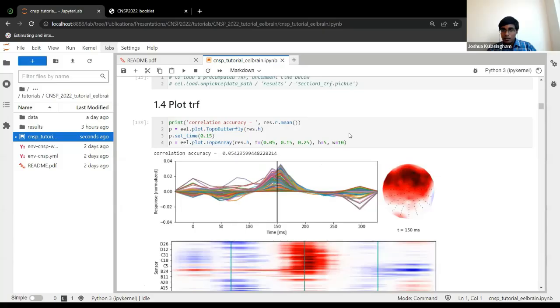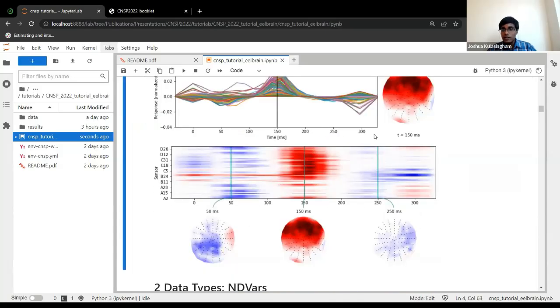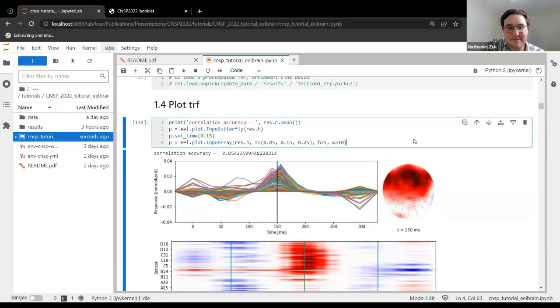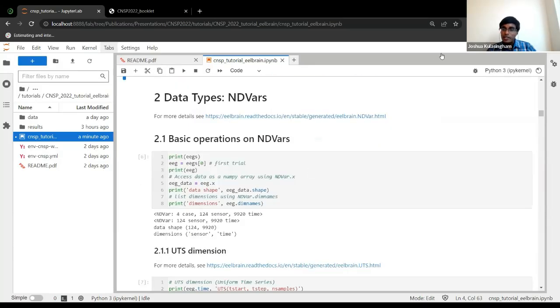Okay, has everyone got this working? In this case, you're fitting it independently to each channel? Yeah, that's right. Boosting will fit the TRF independently at each channel. So has everyone got this working? And once again, if you don't get all the details of the functions, I can tell you later on. Okay, I think it's all fine. Right. So again, at any point, just stop me if I'm going too fast or too slow, and I'll speed up a bit.